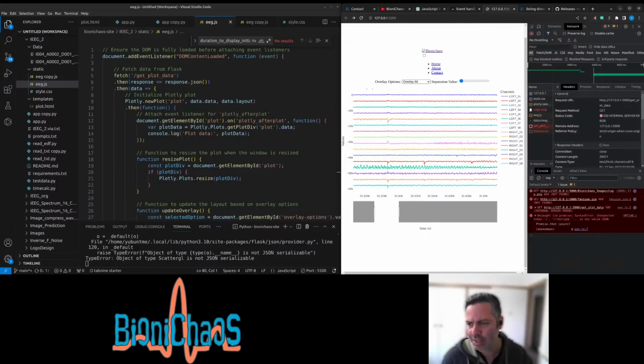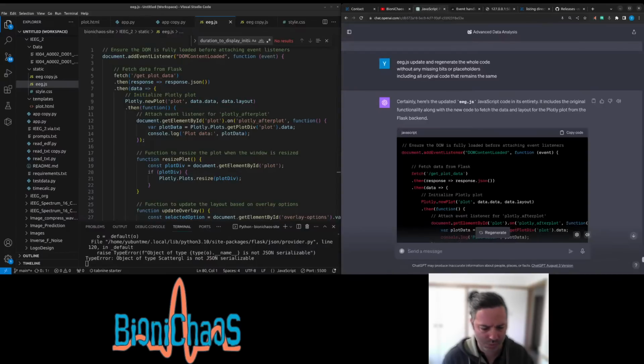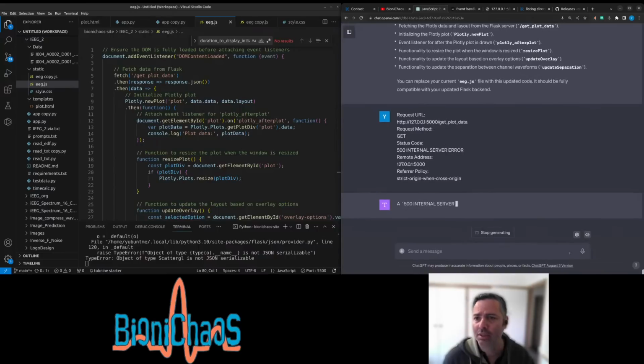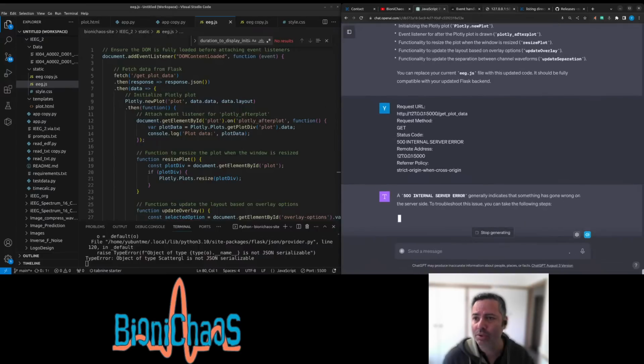So we get a 500 internal error for getting the plot. Why? That's not cool. I mean, everything seemed to work exactly the same as before.